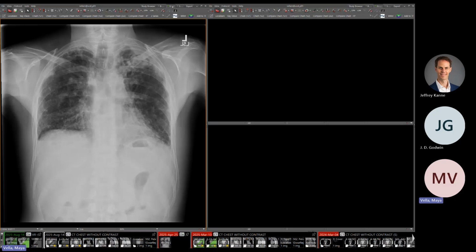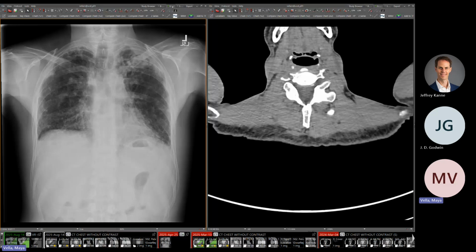This next one I thought was just a cute radiograph, or something that I feel like I probably haven't seen that often on a radiograph, despite seeing it on CTs a fair amount. So on this image, obviously, we've got a lot of coarse reticulation, particularly down at the lung bases, at the peripheries, some up at the apices with some areas that look like dilated bronchiectatic airways. And then we also have this thing here, right? This rounded density with this rim of air around it.